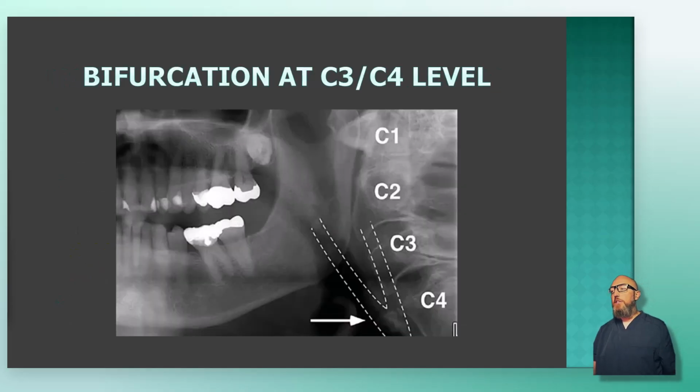And so this slide just shows the anatomy of where to look for it. The common carotid artery comes up, bifurcates into the internal and external right around C4 or maybe the C3 level. So this is the spot. When you see linear calcifications in that window, posterior and inferior to the angle of the mandible, that's your carotid. And it may occur slightly below the hyoid bone or above the hyoid bone. Anywhere there's an artery, you could see these type of calcifications.